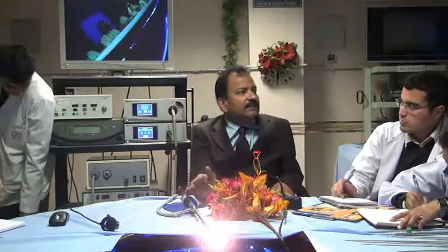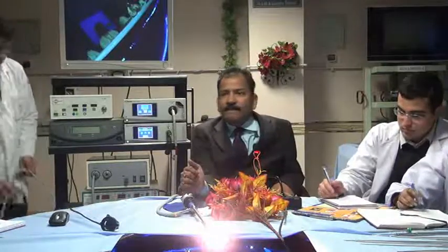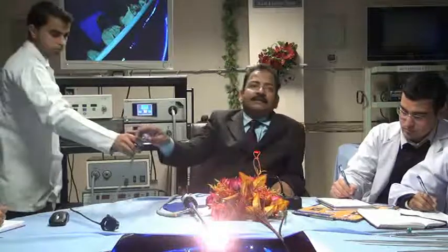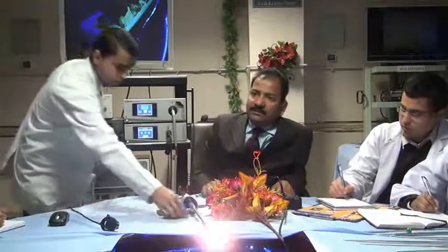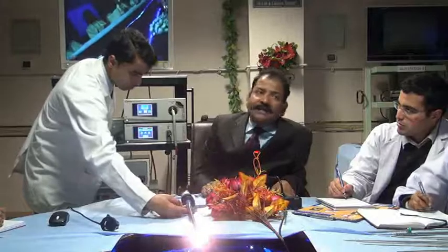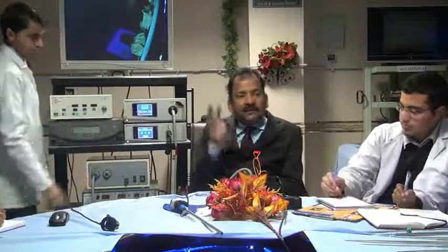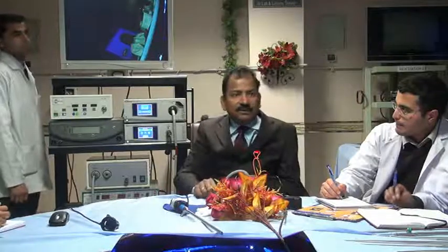But intensity of light is not a big problem. The major problem is color temperature. Color temperature means who is the father of the light. Every light has its origin, and that origin cannot be changed. Color temperature means the temperature at which that light was produced.